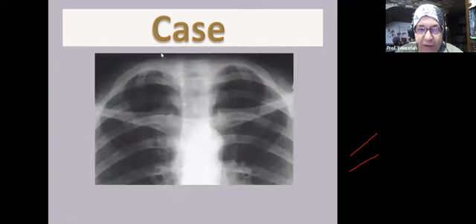Here we have bilateral cervical ribs. How would I diagnose a cervical rib? What makes me sure that's a cervical rib? Especially the problem is when it is a large rib. A small rib is easily diagnosed. This is a cervical rib. But when it's a large rib and it will be causing marked vascular and neurological problems, still they may be missed as a first rib.